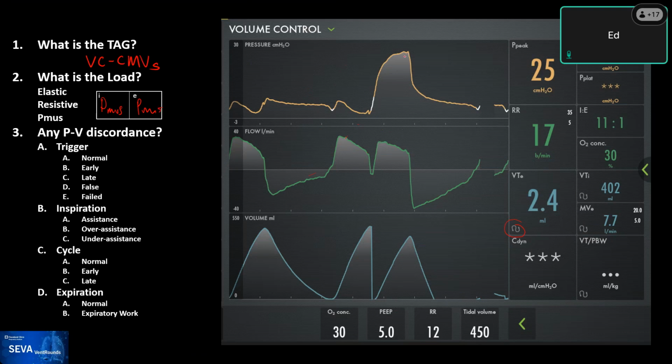And then in this one over here, it would be hard for us to read this but it's most likely all elastic in this second breath. But obviously, this is after the patient has received two tidal breaths of 450. So one barely exhaled and another one. And so this patient got 900 cc's of tidal volume, which is just preposterous in many ways.